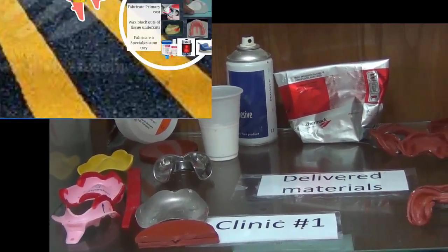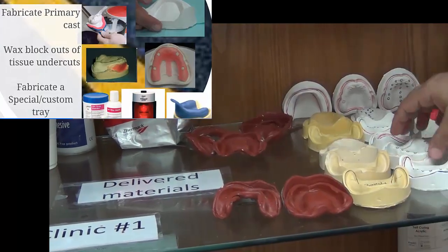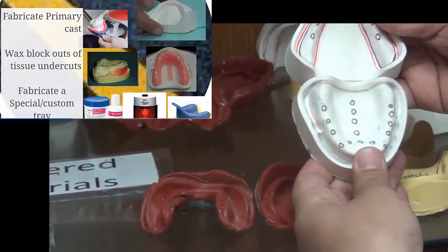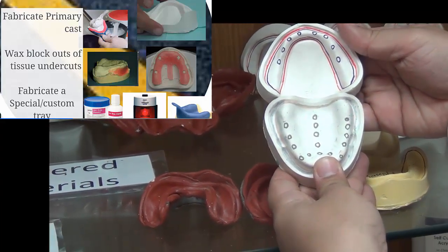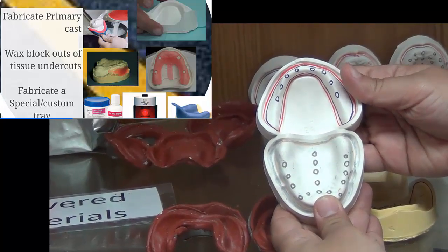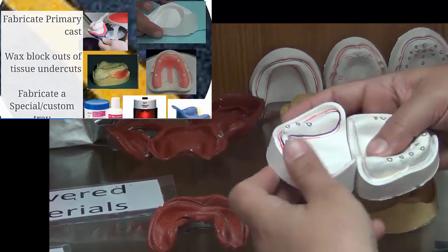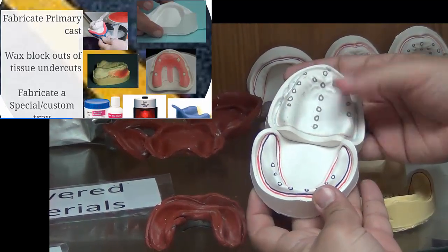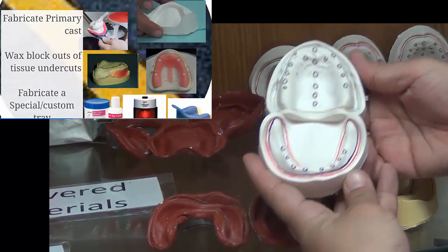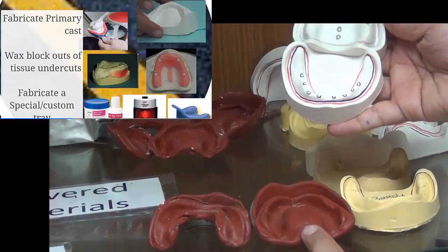In lab number 1, the technician will pour inside these impressions. So these are our primary casts. Usually we make them out of plaster because these are not the actual cast that we will be working on. These are called primary cast or study cast. We could identify the upper and the lower by looking at their direction. So these are the primary casts produced from these impressions. So the result is primary casts.